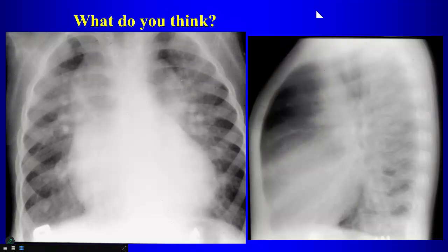All right, so here we have our next case. So this patient has increased pulmonary blood flow and cyanosis, but there's a telltale plain film finding that gives you the diagnosis. What do we have? The snowman sign. Yeah, we have a snowman sign. So this patient will have total anomalous pulmonary venous return, type 1. Type 1, right. Total anomalous pulmonary venous return type 1.